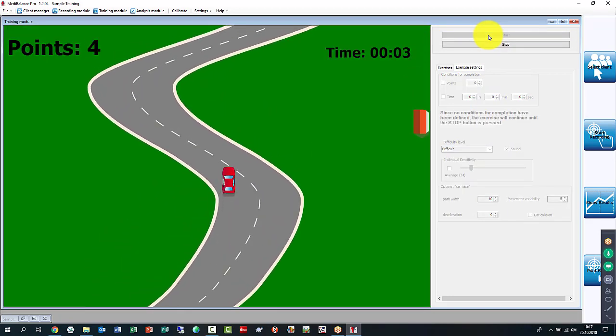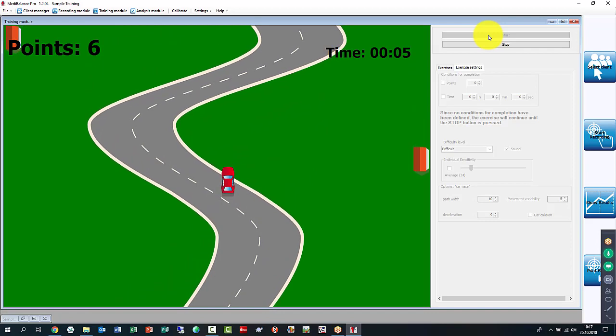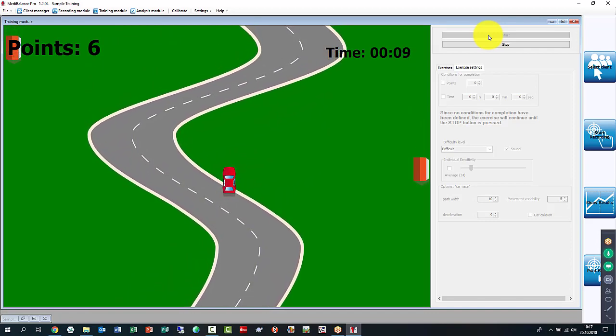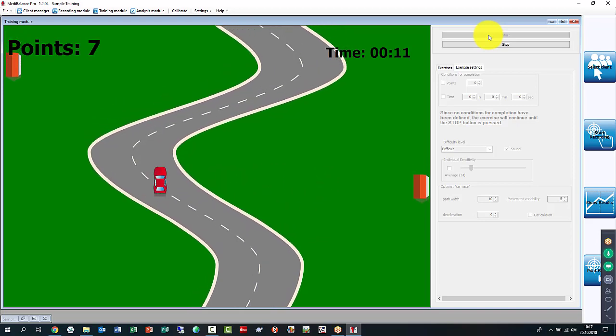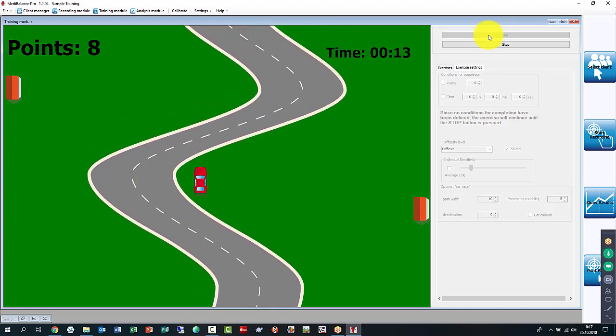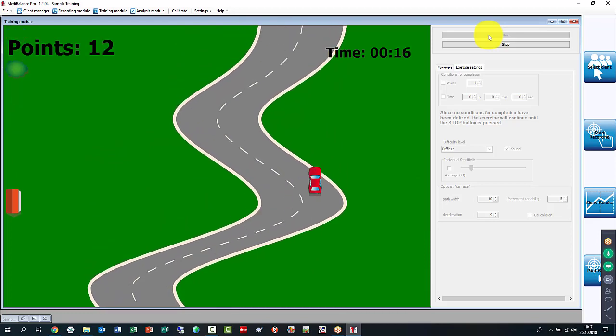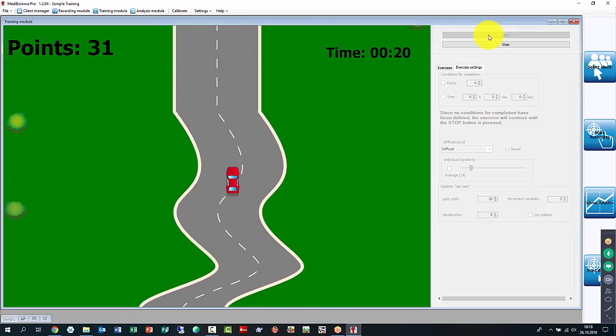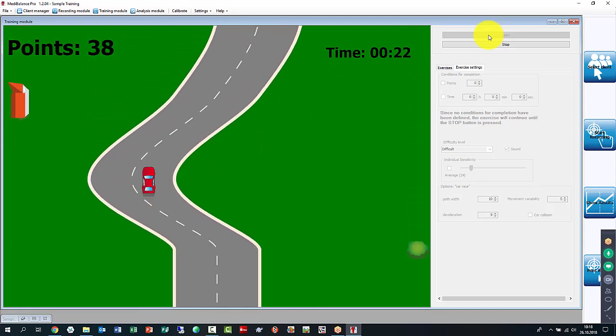This could also be the scope. And if you don't drive on the street but on the grass, it will go very, very slow. So the actual challenge is to not hit the grass, to drive on the street. Let's see if I can make it. And the better you actually manage to drive through here without hitting the grass, the more points you collect.